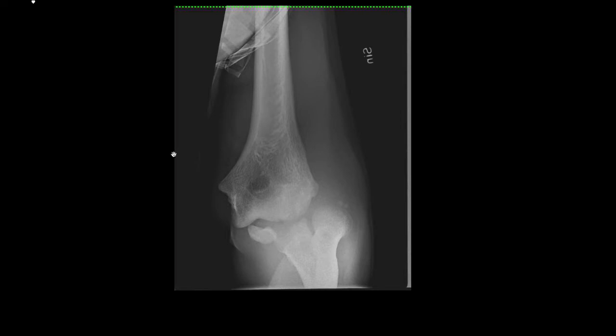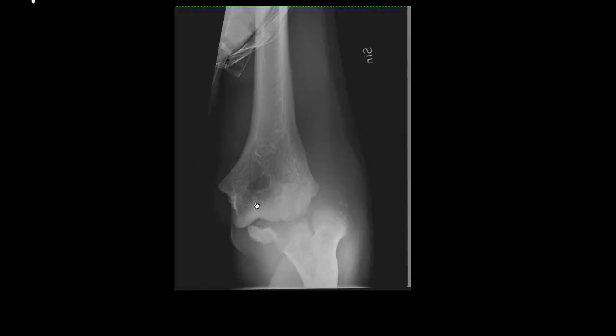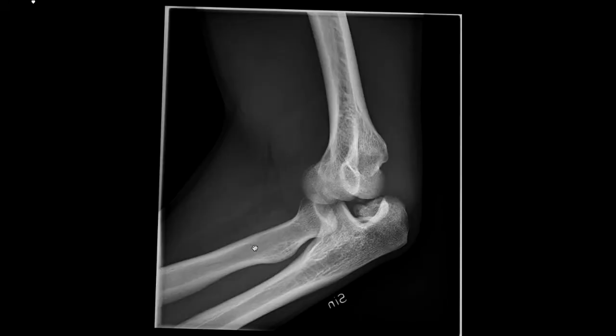And in real life, you don't get perfect images when you're dealing with this stuff, because the patient is in extreme pain. The clinician just wants to get a picture of the elbow joint as good as possible to compare later when they are fixing it. And you can see that it looks pretty bad, and there is some stuff here that shouldn't be there. And on this image, there's a big cutoff here, which indicates a big fracture. So you have to live with this stuff here.